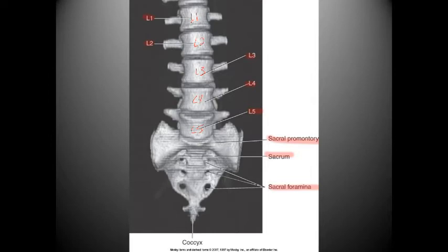Usually this doesn't work so well in older patients because they don't have enough calcium, and everything gets, for lack of a better term, grainy and unappealing, and you cannot distinguish anything. Looking at this, we have the body, and we're looking in the anterior-posterior, or AP, view, and we have the transverse processes here.